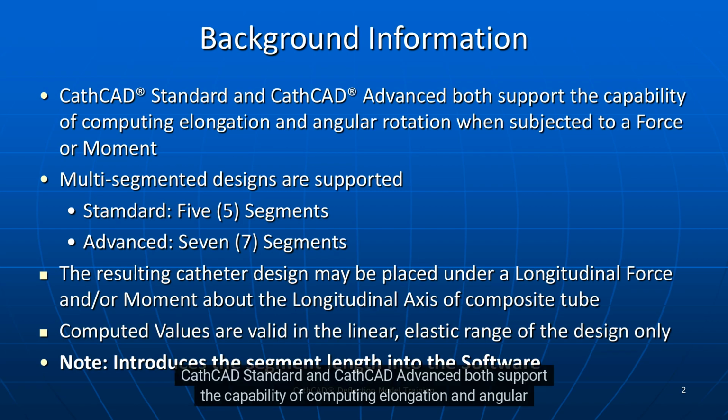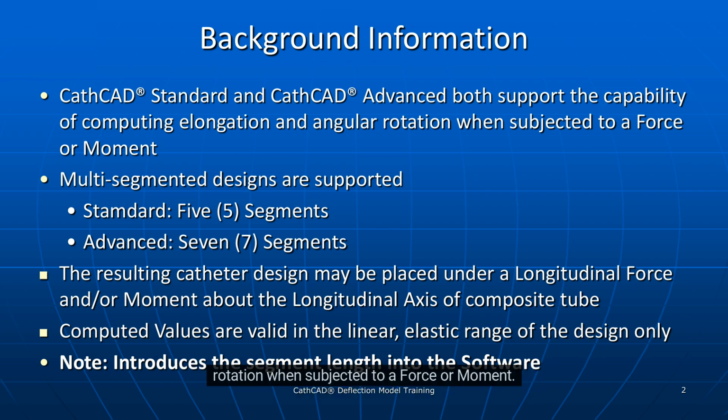CathCAD Standard and CathCAD Advanced both support the capability of computing elongation and angular rotation when subjected to a force or moment. Multi-segmented designs are supported. The current released version of Standard supports 5 segments. The current released version of Advanced supports 7 segments.